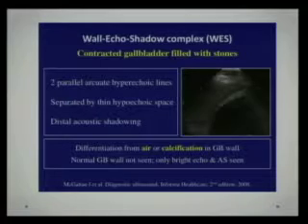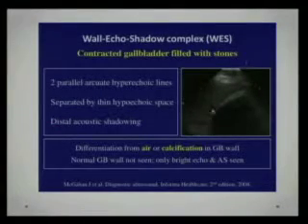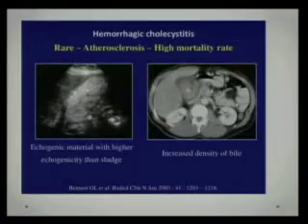How will you differentiate this from air in the wall? If there was air in the anterior wall of the gallbladder, there will be no visualization of a complex. All you will see is a bunch of dirty shadowing. Let's go back to that image if we can.